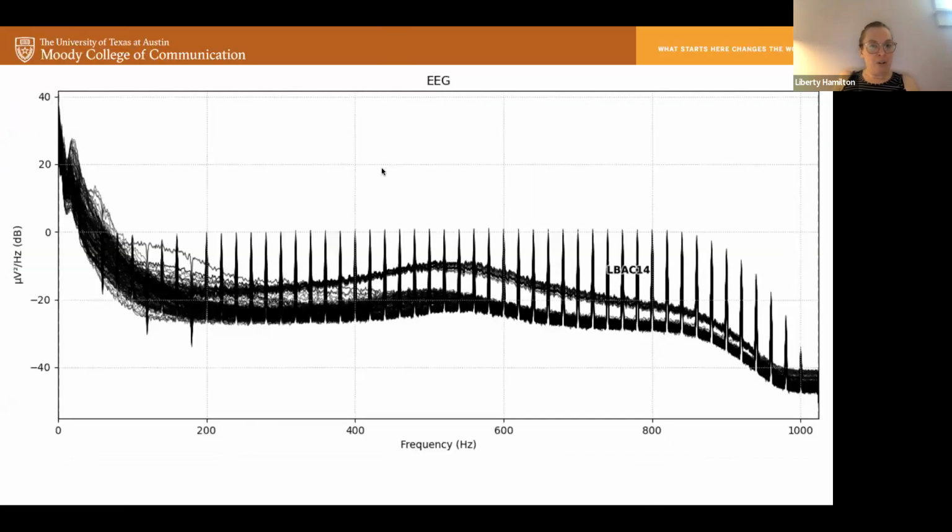If you looked at the power spectrum, this is what that looked like. So this is a repetitive sort of artifact. This is not neural activity for sure. It's also not the same as line noise, like the 60 hertz noise that you might get from an electrical artifact. This particular one was a 20 hertz signal that we were able to get rid of with a notch filter or with a common average reference.